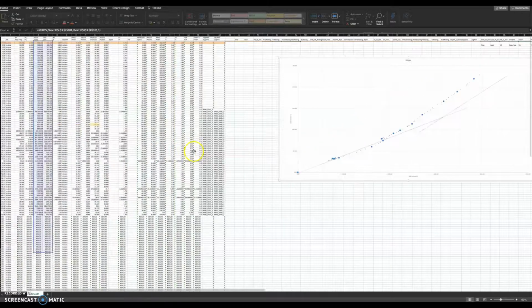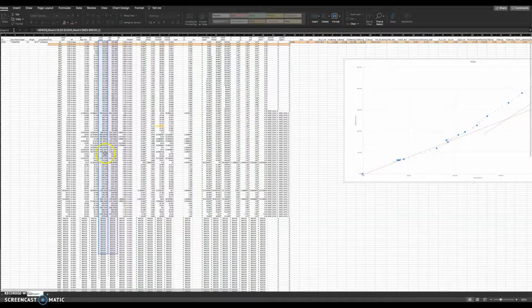So I just highlight them and have a look. This is where it's pulling the data from. This is a plot of VO2 against VCO2. We want the max, but when these people are doing exercise on the bike, it comes to a point where they stop exercising, but the test still records. So I'm looking for the highest value here.